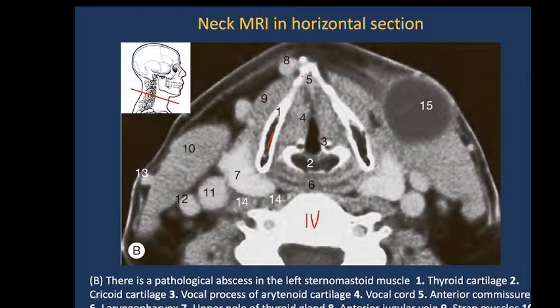And please see here also some of the large blood vessels, like internal jugular vein here, and common carotid artery here. That is large vessels of the neck, and they are located right back to the large muscles called sternocleidomastoid muscles here.